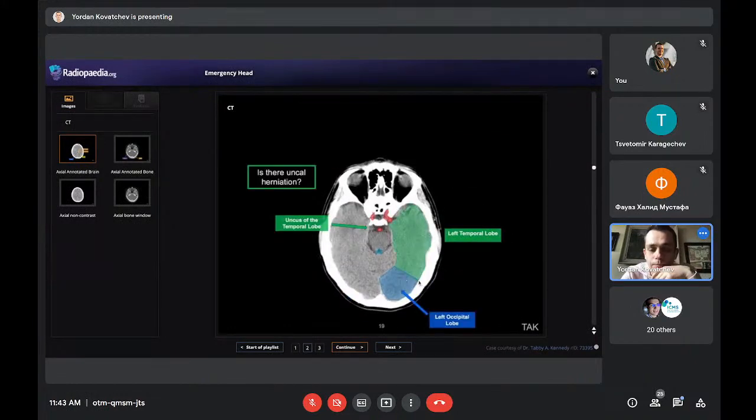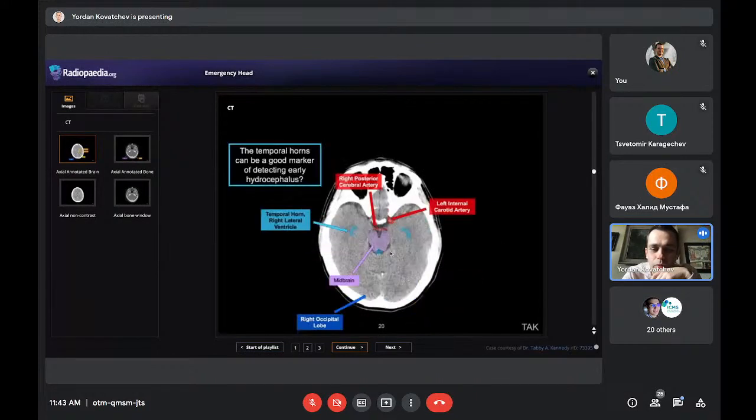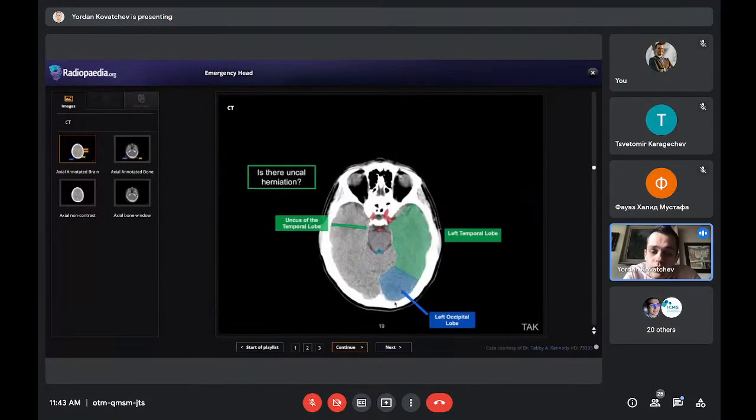We go up, and now we're over the tentorium. Here is the tentorium. It's a bit hard to see here, but when we get over the tentorium, we're in the supratentorial space, where this is the majority of the brain, obviously, and we will look at the main lobes. Here is the occiput.